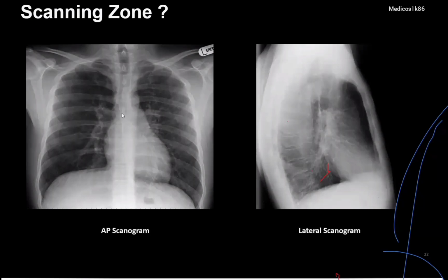Okay. And don't forget, the cardiac acquisition, the heart vessels, will never go to the upper part of the carina. Carina is here, and the trachea is coming down and then dividing into two parts, and this is the carina. You should start from the carina, and you will come until the end of the heart. It is the heart border here, and then you will exceed a maximum of 1 or 1.5 centimeters.